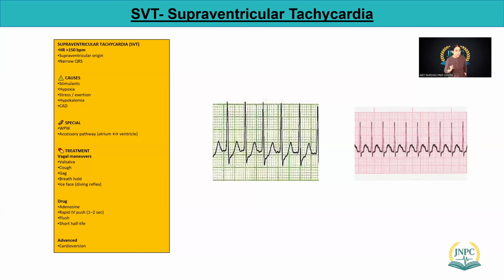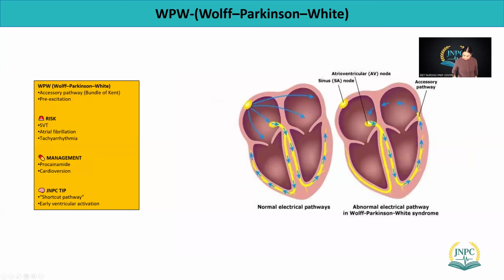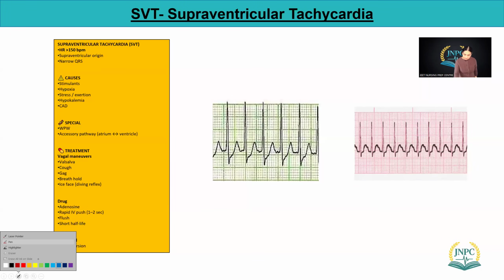Rhythm, supraventricular tachycardia. So if you see this rhythm, look at that timing. If you haven't seen the video on my Instagram page, please go and see how we give adenosine, very important for your exam purposes. So look at that rhythm. Is it regular? First question. Yes, it is regular. But can you really look at the P wave? Where is the T wave? Where is the P wave? Can we look at the P wave really? No. So that's a difference.